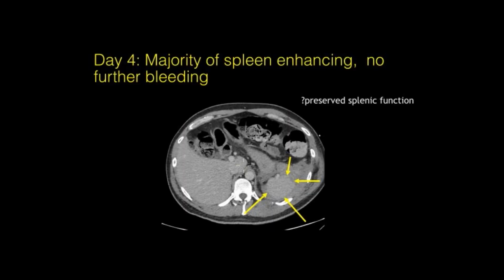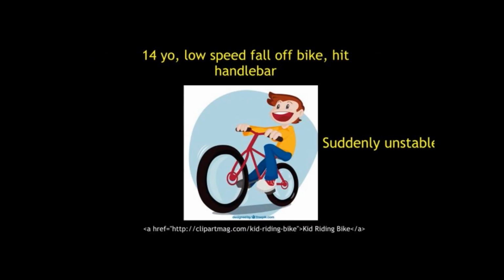So they embolized him, and a few days later he came back for his follow-up CT. He's still got nice residual splenic tissue, and that might mean actually that he's got reasonably preserved splenic function, which is obviously good news for him.